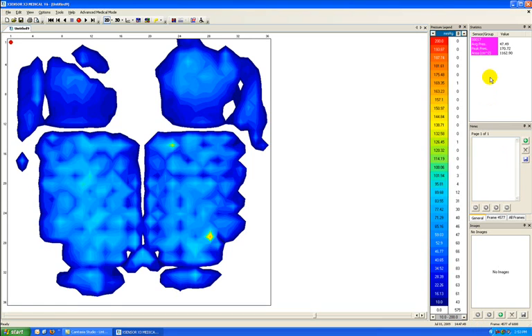If I look to the top right corner of the screen, I see a statistics window. It's telling me that I have pad 0017 attached to the system. My average pressure at this particular frame is 47.49 millimeters of mercury. I have a peak pressure of 170.72 millimeters of mercury, and I have a contact area of 1,162.9 centimeters squared.